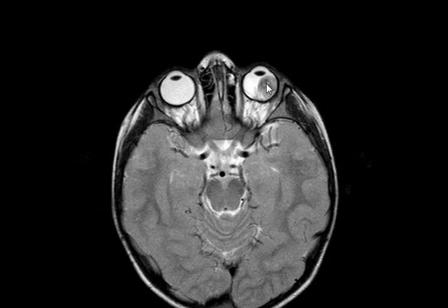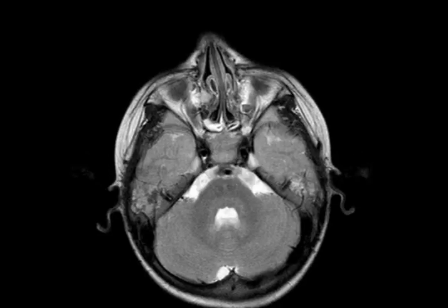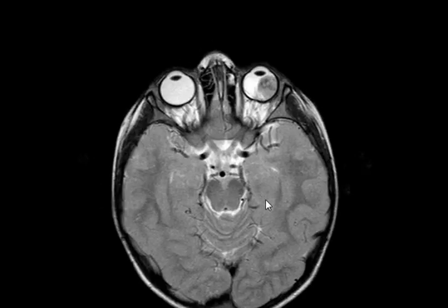Also there are some signal voids. Some low signal intensity with other high signal intensity. So it's heterogeneous, but mainly hypo. Mostly hypo. I would say ISO, but no problem. ISO hypo doesn't matter that much. Okay. هذا ال T2. Any other findings before we shift to other sequences?